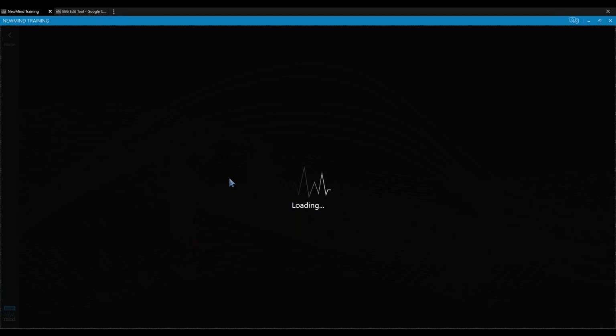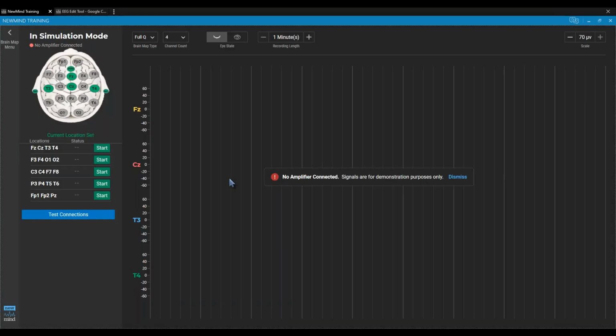While you're watching those signals and you're seeing all the artifact, try to put together how much clean signal you've seen compared to artifact, because that's going to tell you how much time you're going to need to add in, since you're going to have to shut off that auto artifact detection.